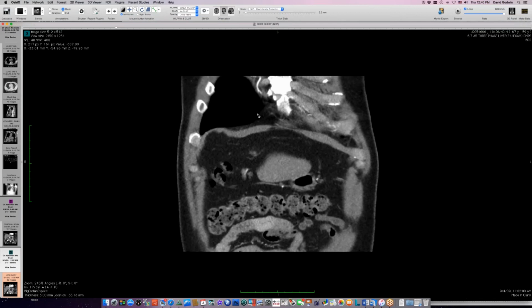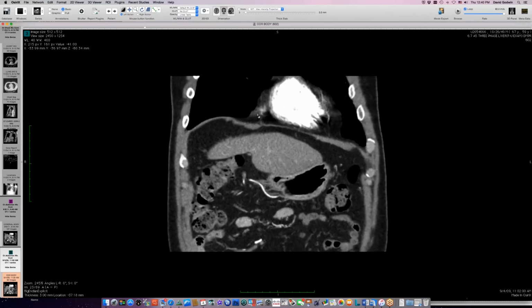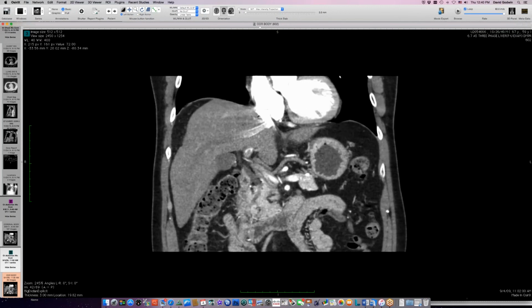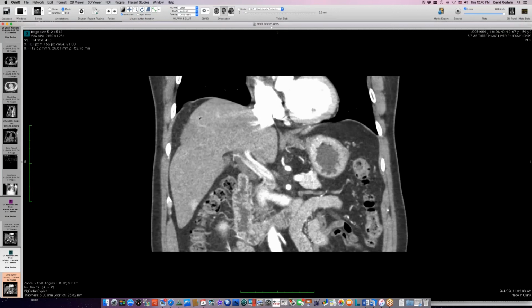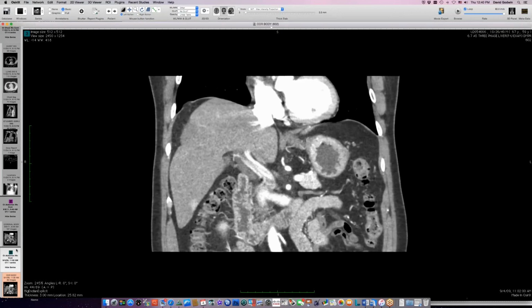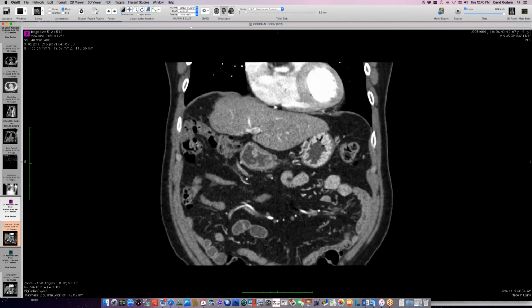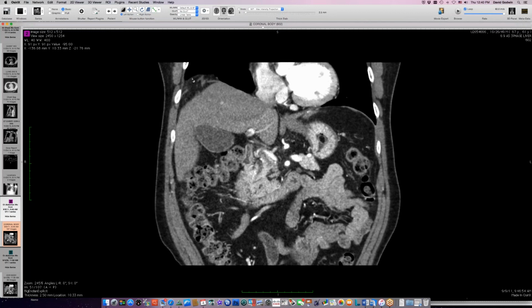Okay, this fellow had an ablation of a hepatocellular carcinoma, radiofrequency ablation back in 2008, and has this defect at this point in the diaphragm that resulted from that. And at this point, we've got a little bit of fat going through it. And at a later time, things get more interesting, and he starts to get more and more stuff going through the defect. This is a few years later, and you can see that there's a lot more fat penetrating now through this diaphragm defect.